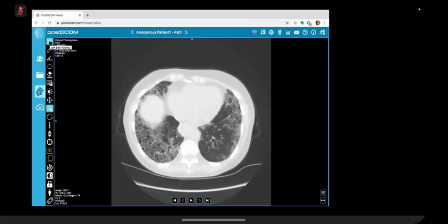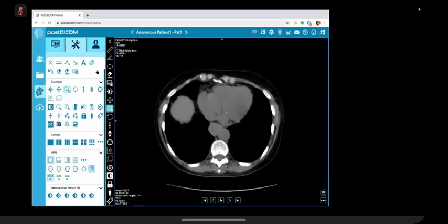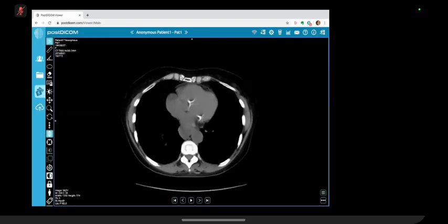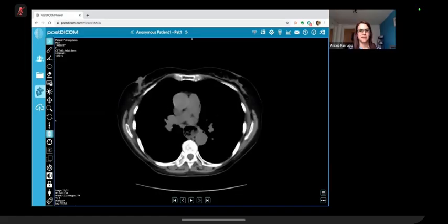So I would check for other symptoms of systemic sclerosis and CREST syndrome as well, whether this patient has got CREST syndrome. But the findings here are fibrosis as part of the systemic sclerosis and esophageal dilatation. Well done. So that's the key. They will often do this in the exam, at least that was my experience.